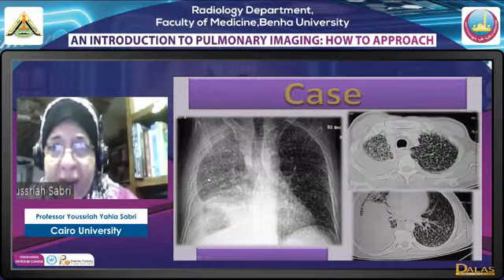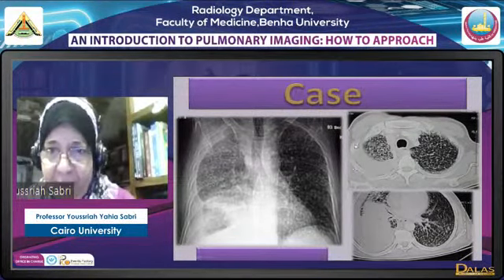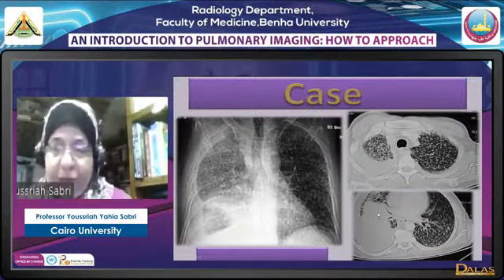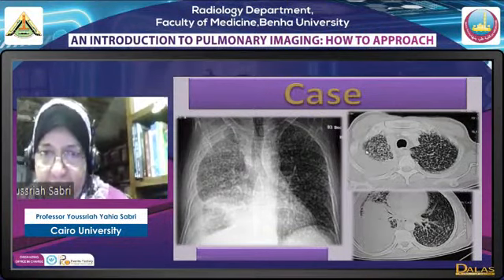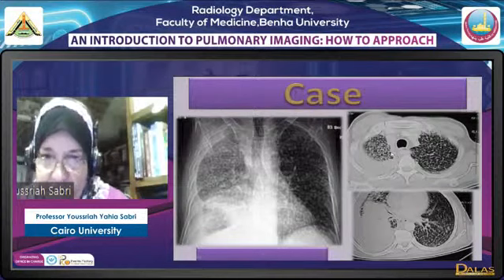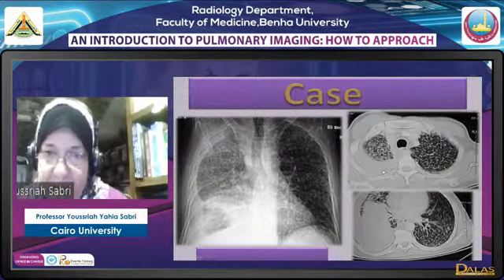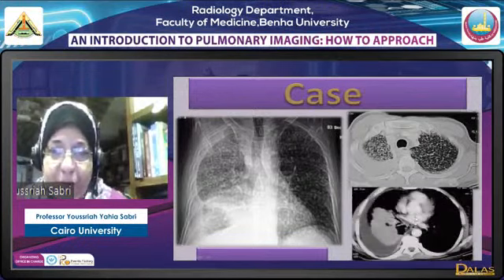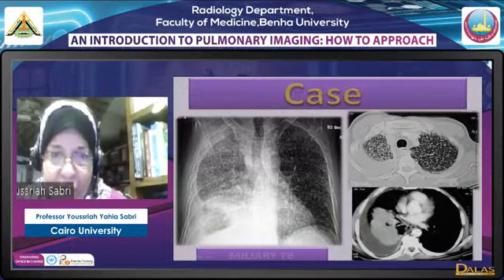This was actually a case of miliary tuberculosis. In addition to the miliary shadows, we have the effusion and we have a consolidation here. Now, mind you, this effusion in the supine position, the anterior margin of the effusion is parallel to the rib. And this means I'm dealing with a free effusion. It is exactly parallel to the concavity of the ribs where it is present. Okay, this is effusion. Multimorphic lesions where more than one lesion is present suggest tuberculosis.